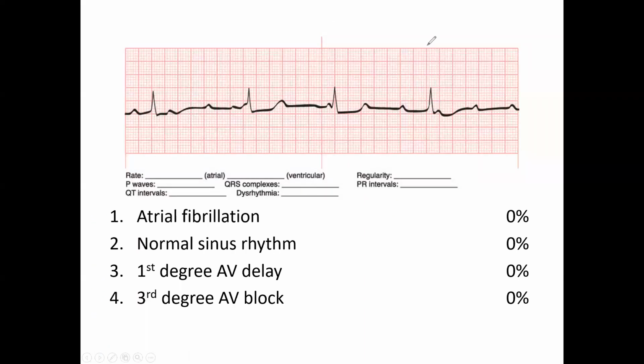Take a peek at this one. Does the patient have a pulse? Patient has a pulse, is weak and thready. Your ventricular rate is 40. Atrial rate, so P wave here. So it's 3, 4, maybe 5, 6, 7, 8, roughly 80.